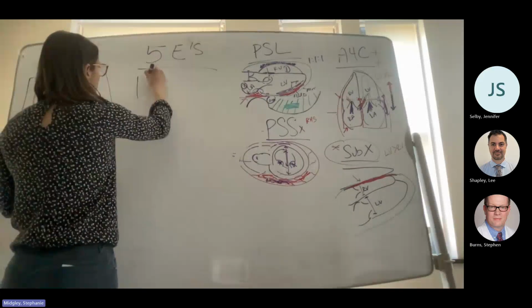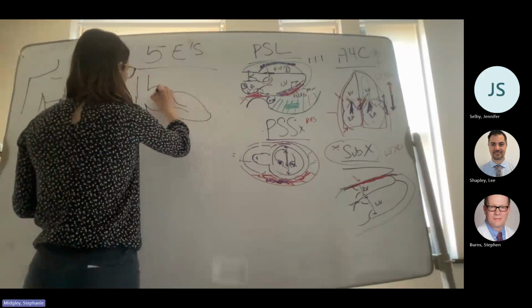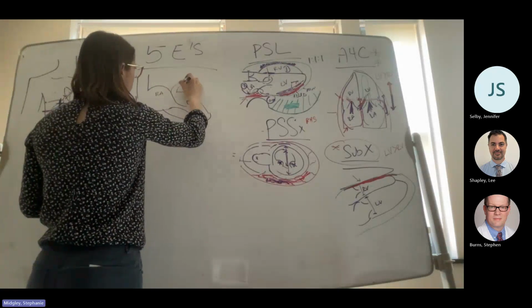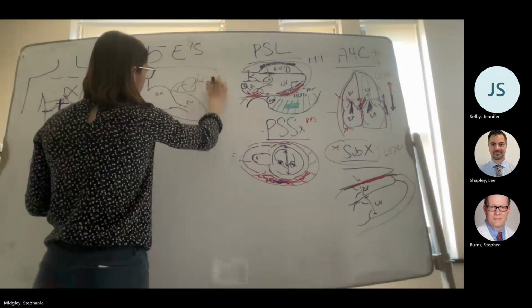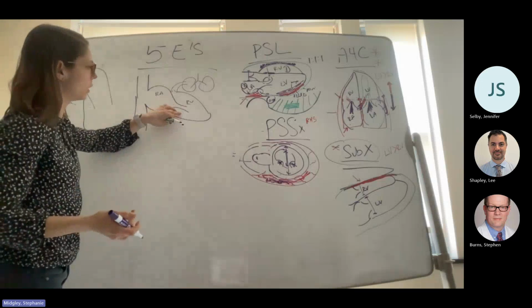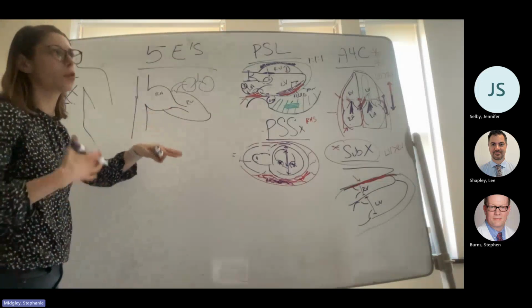So for right heart strain, I'm going to focus in on the right heart. So here's my RA, here's my RV. Here's my pulmonary artery, and then to my lungs. I'm going to say all this in the setting of acute PE. And my caveat is specifically with PE, if there's right heart strain, it's generally an indication that there's going to be some degree of instability.